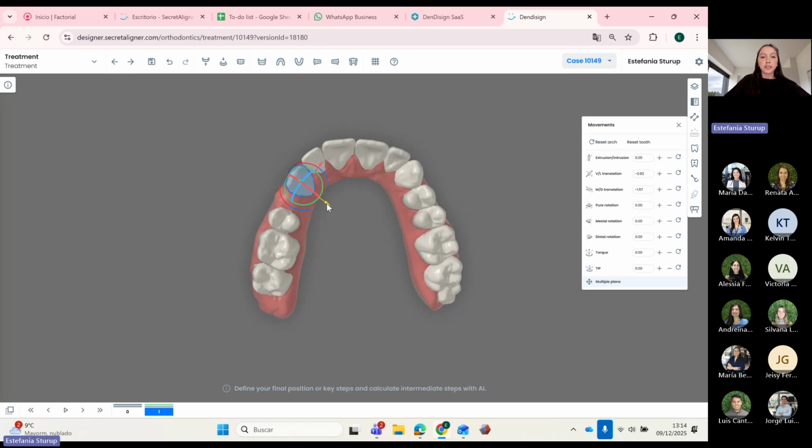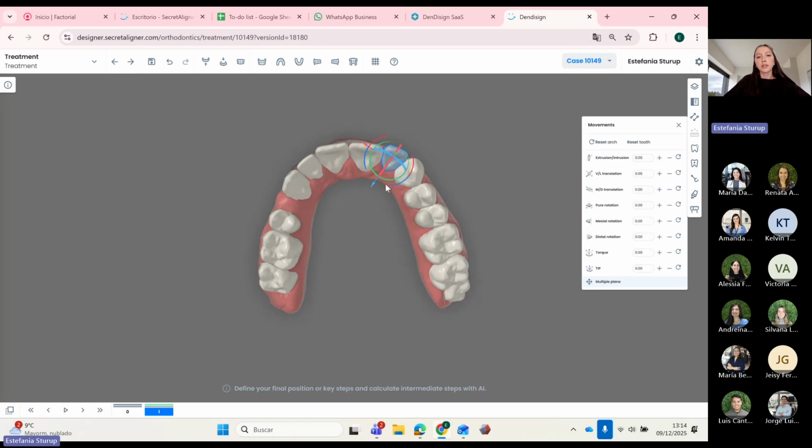We will be doing some webinars with designing some cases, class 3, some cases of class 2. We will also be showing complex cases. Okay, so let's say this is kind of what I want.